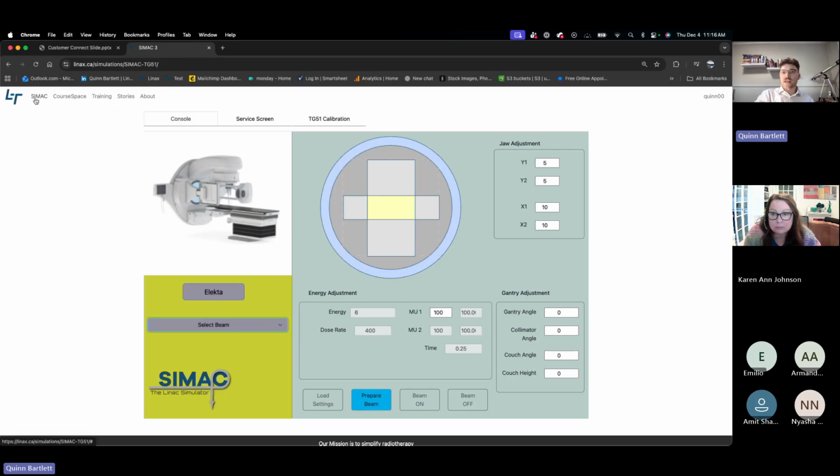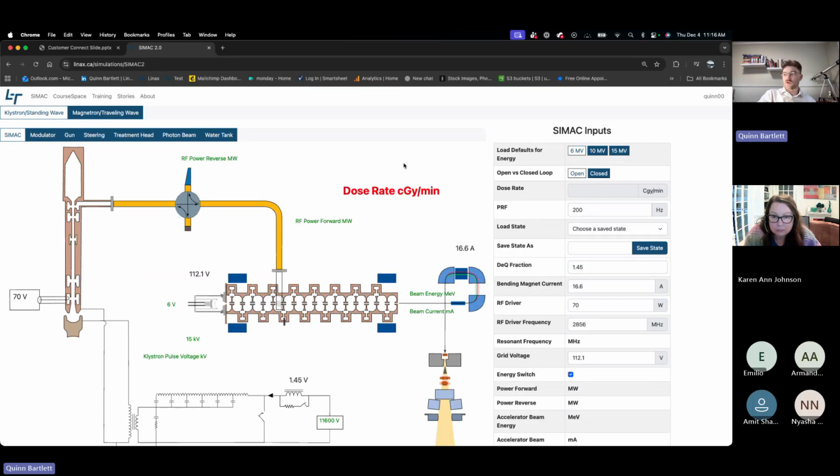And then I just wanted to show you again on our normal simulator that you can also achieve this. I have some things set up for us. So again, I'll come into the same variant, do the 6 MV, and I'll show you that we can actually get the exact same values back out, and show you that they're using the same models in the same spot.